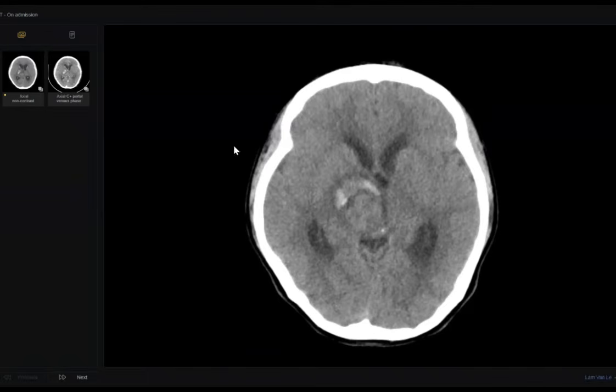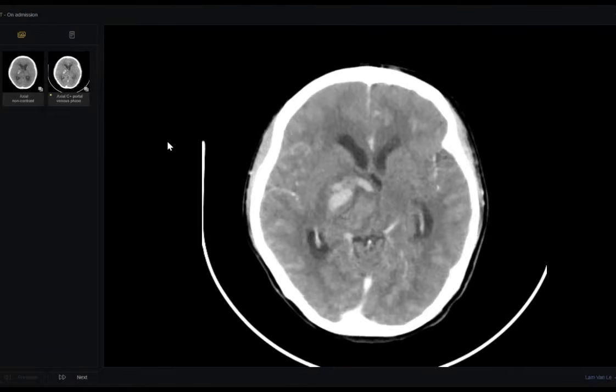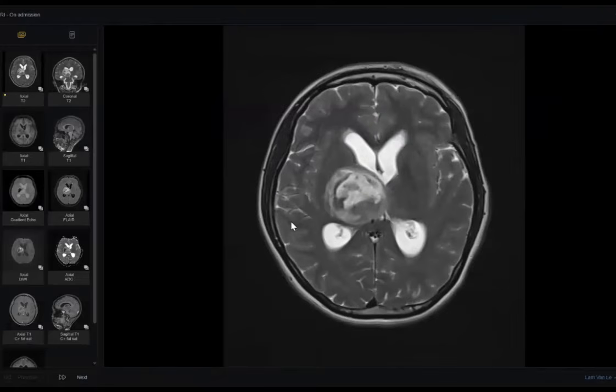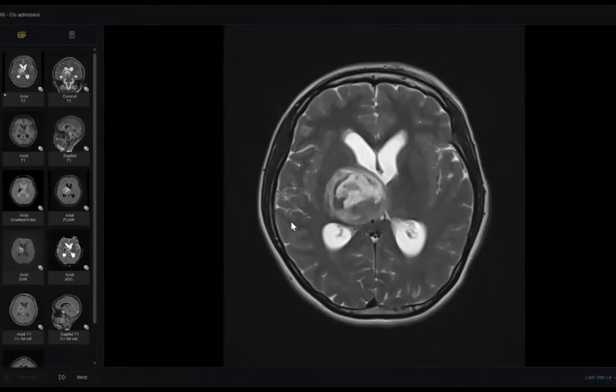And after contrast, look well, please. There is something here. At least have a doubt. Tell the examiner, I have a doubt about this one, please, I want an MRI, post-contrast MRI. He will be very happy. Even if you are doubtful and not sure, tell him let's do an MRI, we won't lose anything. This way we are saving the patient's life.